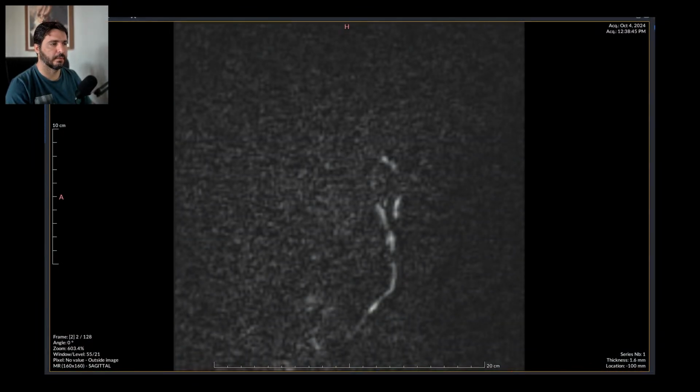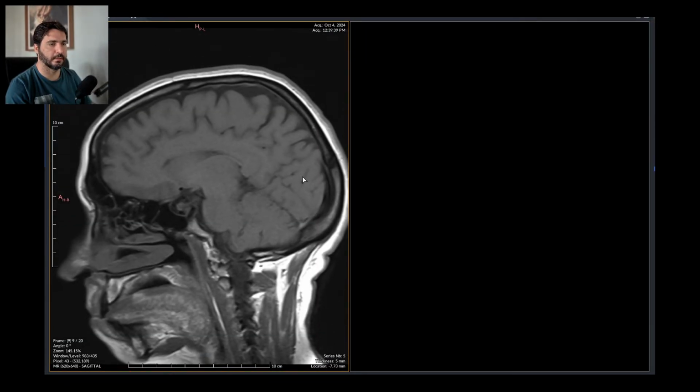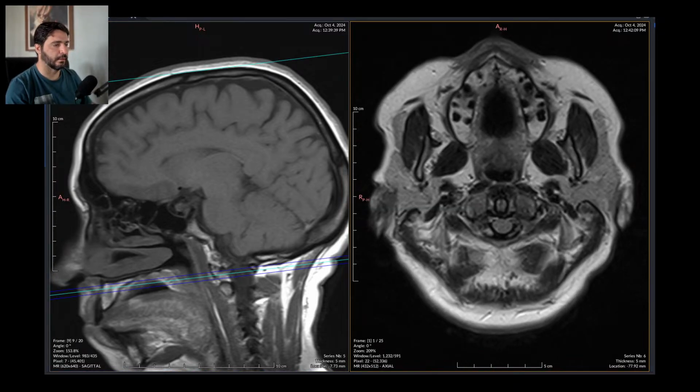It says headaches. She has some kind of headaches for the last 6 months. So let's go with that, because I'll never guess this writing. This is just impossible to understand. Was there any contrast enhancement? No contrast enhancement. So I'll grab a non-contrast enhanced normal brain MRI template, because reasons, why not?